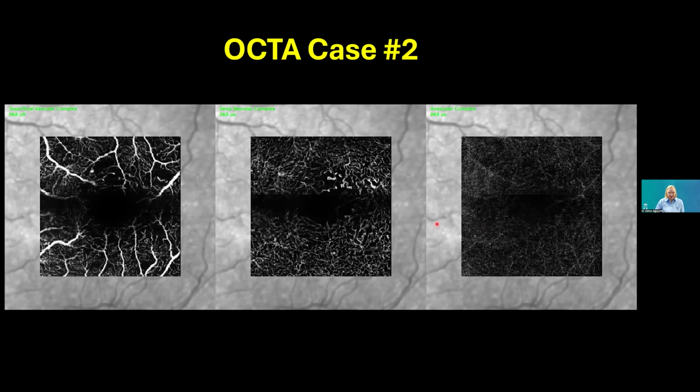And so, of course, we did an OCTA to find out if this is retinal neovascularization or was this a very prominent area of IRMA. Of course, we didn't get the best OCTA scan in the fovea, and this is common. These black lines going through our scan are motion artifact. So if the patient is not staying still and moving their eye a little bit or their body, then you can get these motion artifacts that are really common to OCTA, right? Because we're basing this off of motion contrast, but hopefully you can still appreciate that in the superficial vascular complex and the deep vascular complex, we have a lot of irregularity of these blood vessels and some capillary non-perfusion.